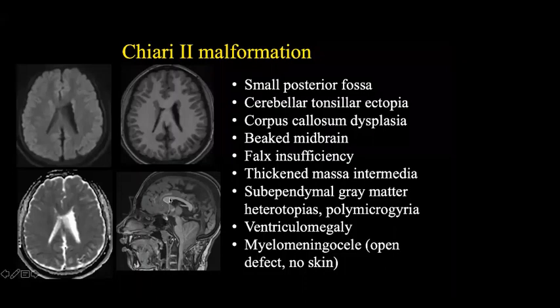And then, for example, in this case, we also lose the isthmus. So the isthmus is the narrowest portion. It's similar to the isthmus of the fallopian tube. It's just a very narrow segment. But in this patient, it's almost like similar thickness between the body and the isthmus. So that's sort of corpus callosum dysplasia.